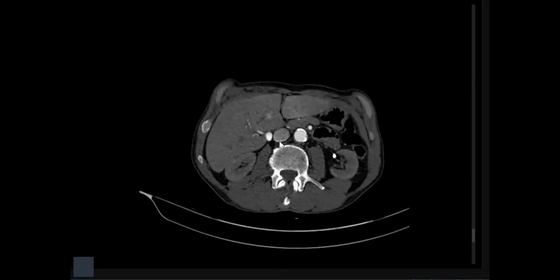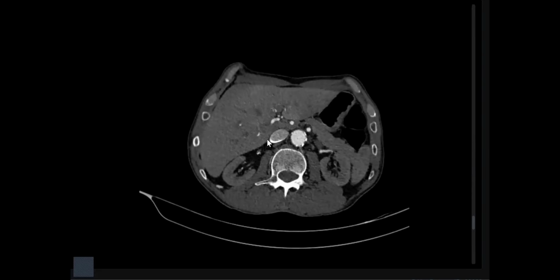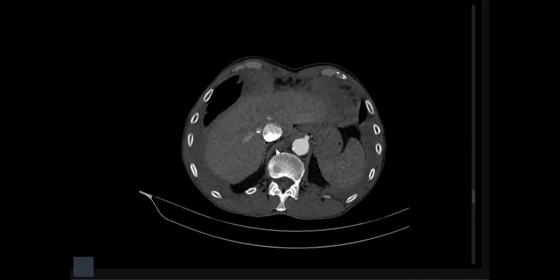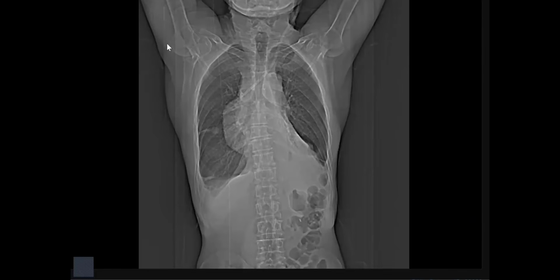the IVC. Is the IVC normal caliber or flattened? Later on, in my routine practice, I will assess other phases like venous or delayed. Is there hyper enhancing persistent renal enhancement, hyper enhancing adrenal, and so on? It's very important to rule out shock syndrome. The patient is bleeding. But generally, you did it well. Thank you, my friend.